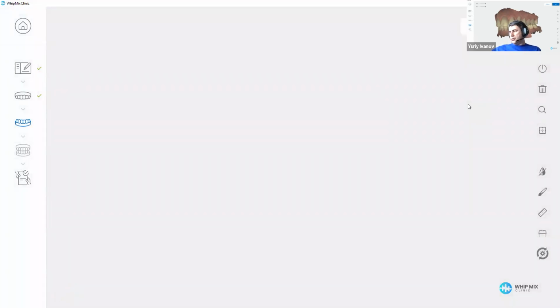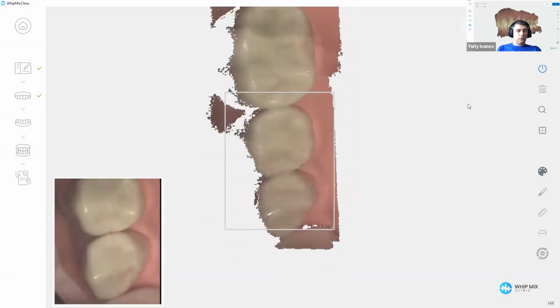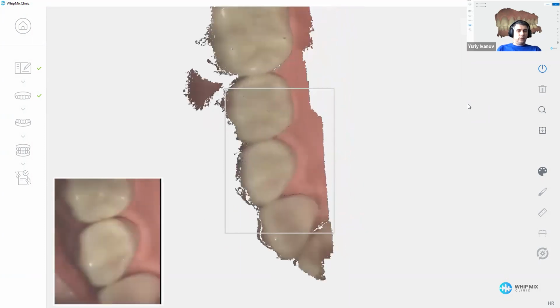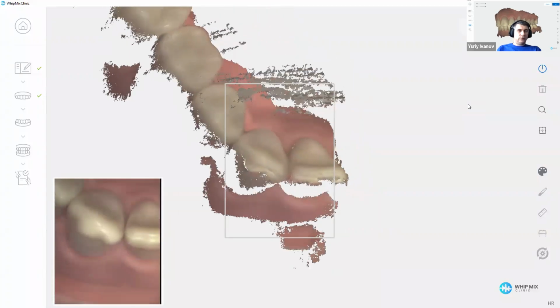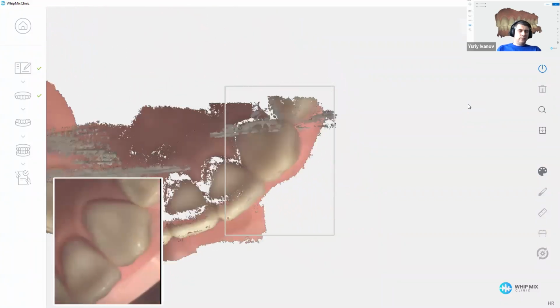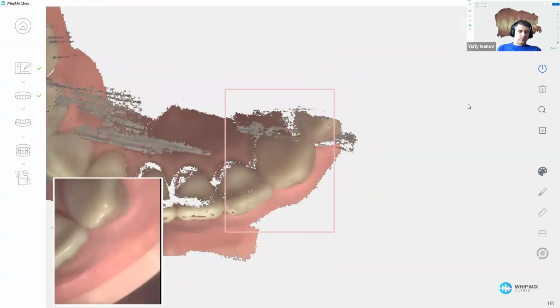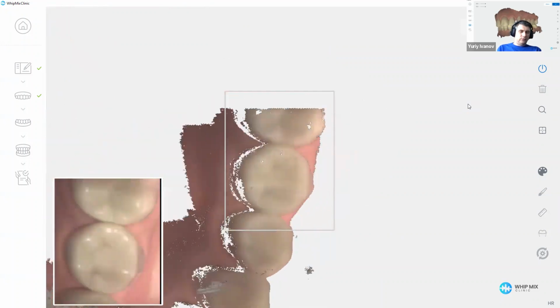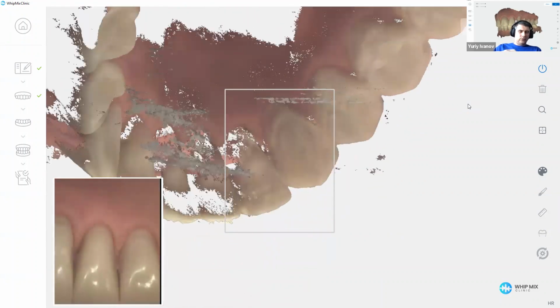and it will bring us to the lower jaw scan arch, and we can start scanning the lower jaw the same way. The strategy is occlusal, lingual, buccal. Be really careful with anteriors to catch both facial and lingual surfaces like this, and go distally. Oops, sorry, it's a typodont model and everything on my hands here. Yeah, rotate it lingually and scan the lingual surface.